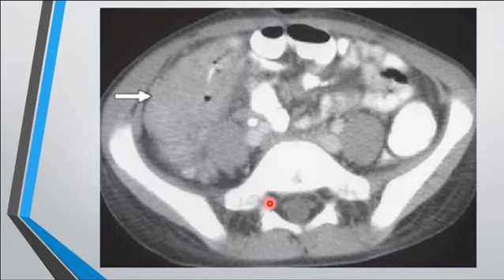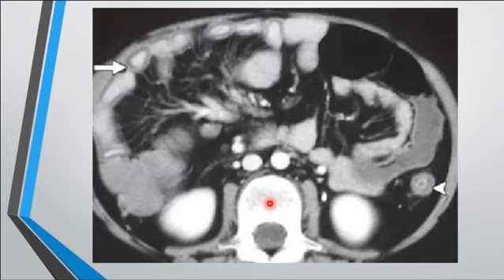I'm giving you lymphoma because lymphoma usually doesn't cause bowel obstruction. It's circumferential, surrounding, like a sandwich sign, and the lumen is narrowed but there is no bowel obstruction, which gives an appearance of lymphoma. Other possibilities are Crohn's and TB. In this case, it was Crohn's.